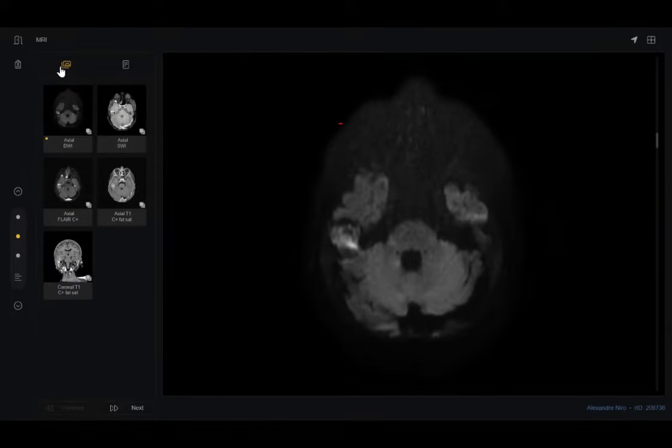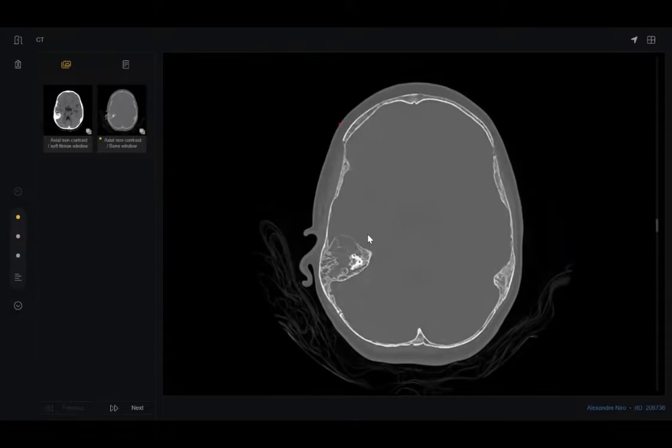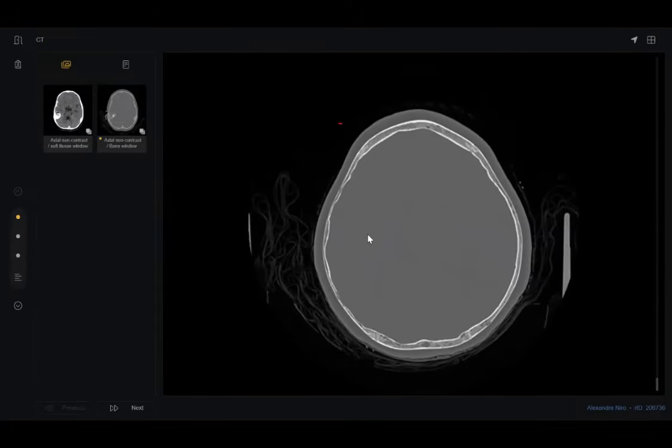Malignant teratoma. Okay, so have a look again at these CTs, bone window, one by one. Sir, there are multiple lesions. I could appreciate them in the base of the inferior occipital bone as well.